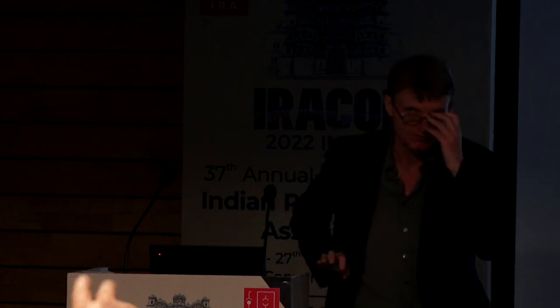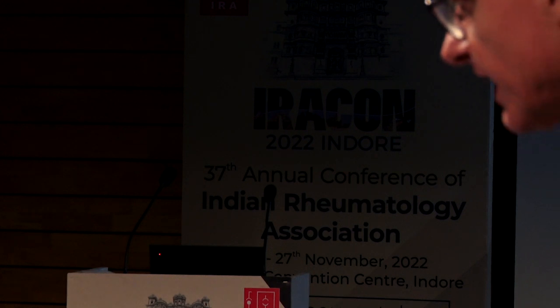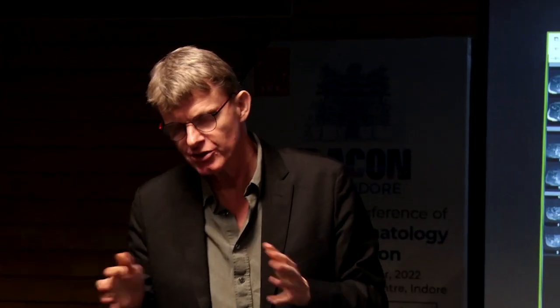Yes? Please say it again. How do we get this 4x4 image here on the left side? You only have 2, but that doesn't really matter. That's because you will not look at images there, you will just take the first image and put it in. So actually that's totally unimportant.